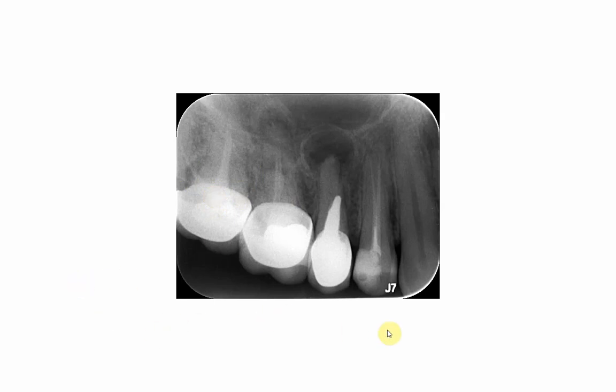The third thing that we have, again, is a failure to keep the same distance between the occlusal surface of the teeth and the margin of the film. The film has not followed the curvature of the arch, but it was acceptable, though again not the total coverage as you would expect. When you extend 2 millimeters, you will see the whole periapical area. If the sensor goes below more than 2 millimeters, there will be a cutoff in the apical area.